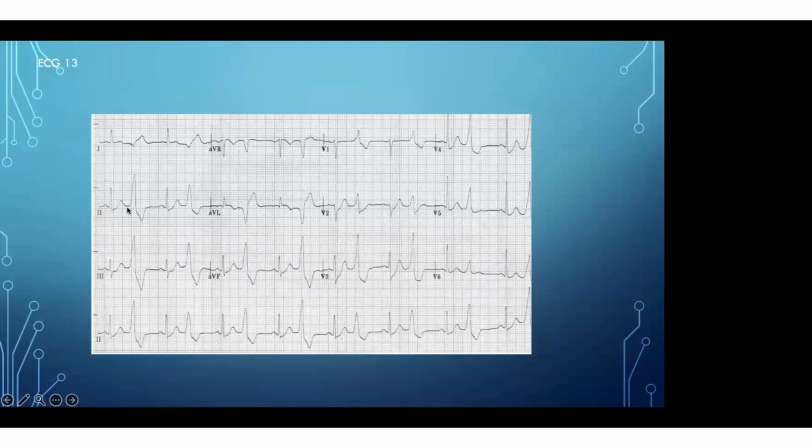Proper conduction system activation of the ventricle is followed by a ventricular ectopic beat that activated the ventricle retrogradely, and then there is a compensatory pause followed by a QRS, and this is coming in a bigeminal fashion. So this is ventricular bigeminy. In usual practice it is also very commonly seen, usually in patients with dyselectrolytemia. And without any structural problem also we can see this kind of arrhythmia.